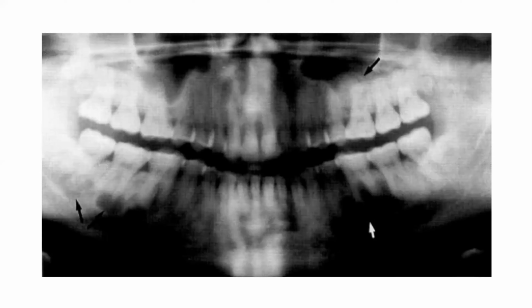So the radiodensity, again, commences in the early stages with a radiolucent presentation. And then the intermediate stage presents multiple radiolucencies with gradual increased patchy internal opacities. And then in the later stages, multiple irregular dense radiopacities within individual lesions, sometimes surrounded by a thin radiolucent line.